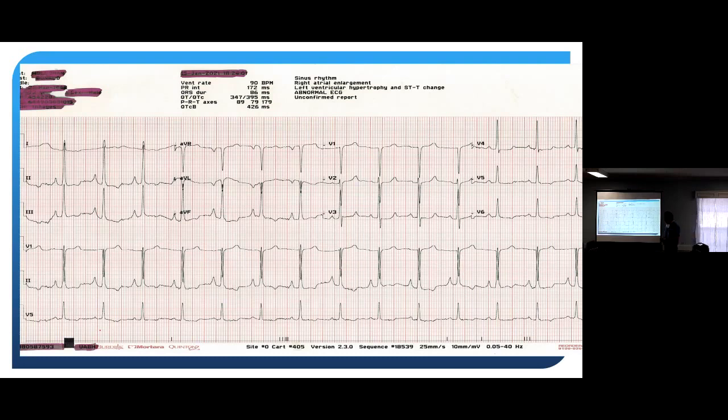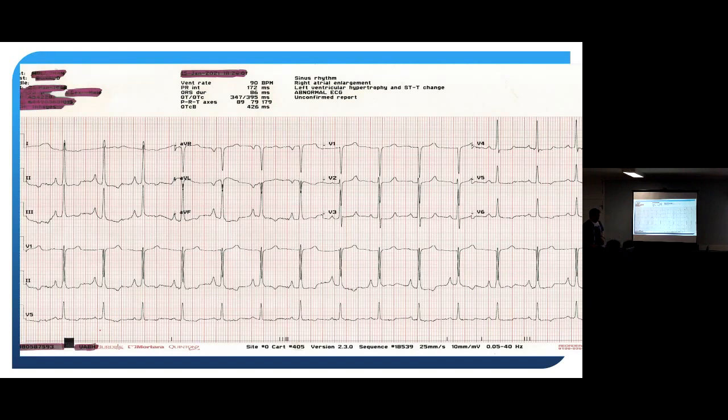Okay-ish, that should be a good one. Yeah, I look at injury patterns, I, aVL, lateral, not scary. II, III and aVF, some artifact, but still not scary. V1 through V4 looks good. aVR is fine. I go back, I look at my intervals, nothing scary. And I look one more time for injury patterns before I put it down. So this guy shows up at the fire station saying he just hasn't felt good in a couple of days. He wants a 12 lead. I look at this and it's like, hey dude, your 12 lead's fine. You can go home, no problem, right?